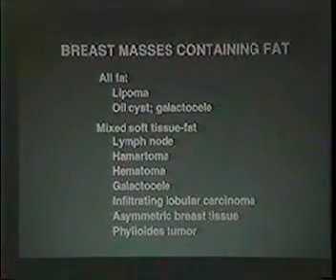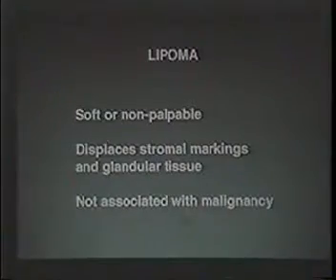Everything that contains fat is not benign. There are some ill-defined masses that contain fat that will be cancers. But these well-defined, well-circumscribed masses containing fat are benign lesions. And let's just look at a few of them.